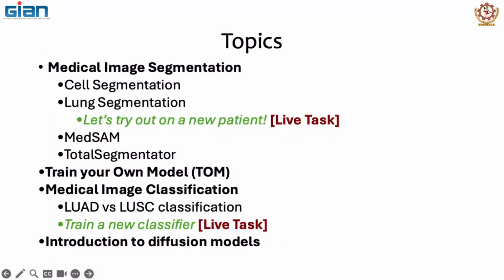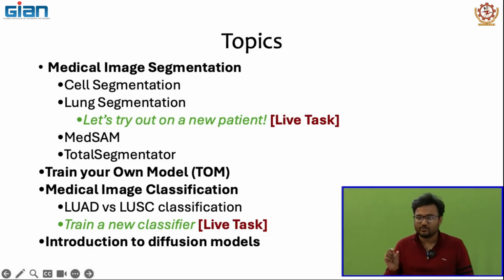The next thing that we'll try out, I'll skip MedSam again for the next day. I don't know why I have this enmity with MedSam, I'm just postponing it. But I think TotalSegmentator is something which you will find more interesting. So let's discuss that first, and then we will quickly do the same tutorial with TotalSegmentator.